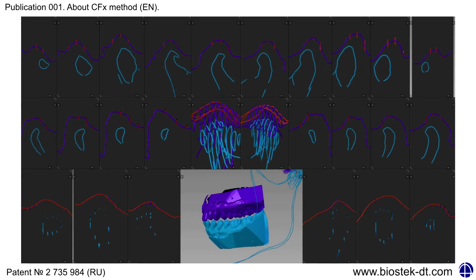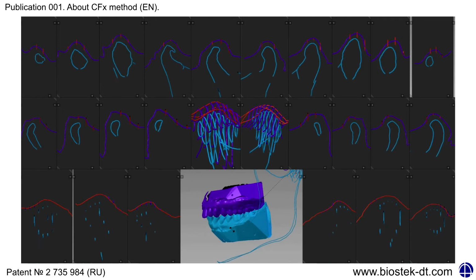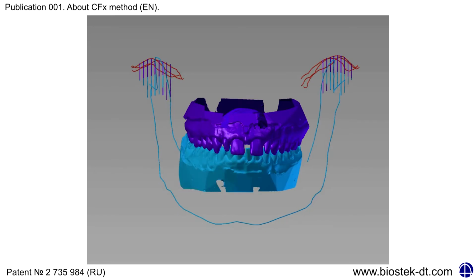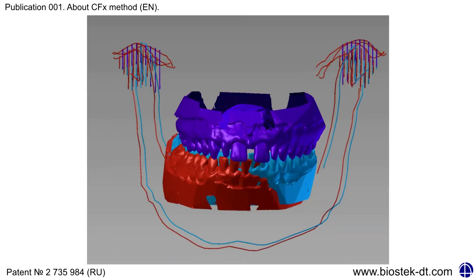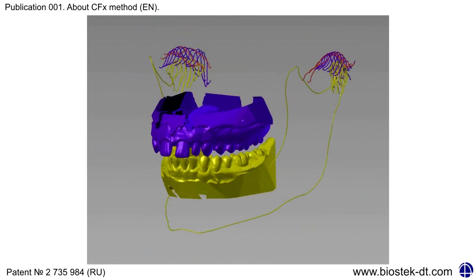This visualization allows precise control of movements of condyles in respect to fossas of TMJ during mandible movements. In this clinical case example, we did not use recording devices. To analyze the situation of the patient, standard gnathological positions of the mandible that are used in assessments were integrated into the 3D scene. Protrusion, the movement of the mandible forward. Resting or slightly open position. Right lateral protrusion, side shift to the right. Left lateral protrusion, side shift to the left.